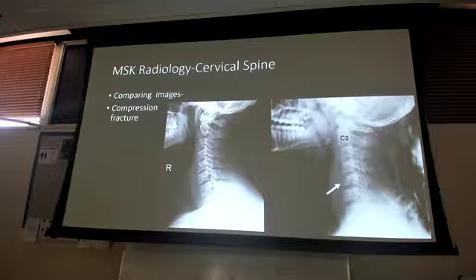So with the spondylolisthesis, if you're going to annotate that with compression fracture, would it be C5, 6, and 7? Yeah, good question, right? So what I would call in this one, C2, C3, C4, C5. So if, and this one doesn't have it, right, they're lined up. So if I had the spondylolisthesis on this one, 2, 3, 4, 5, I would say I have a C5 compression fracture, and then C4, C5, whatever direction spondylolisthesis, right? Still the two vertebrae affected, and then you name it from the direction of the superior vertebrae, which way is it going?